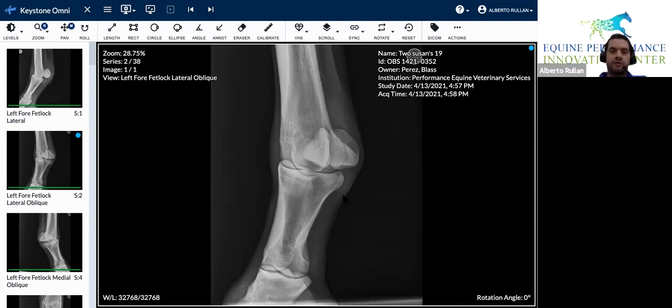Okay, good. So then we go on the distal fetlock, P1 right here. You're going to find some fragments over here. And this is the lateral oblique. Another name for this view is DLPMO, right? So this is the P1. You go drawing over the border of P1, distal P1, and you come up and you read this whole P1. Then you go to P2, and you go on the checklist that I gave you to make sure that you have absolutely every structure covered.